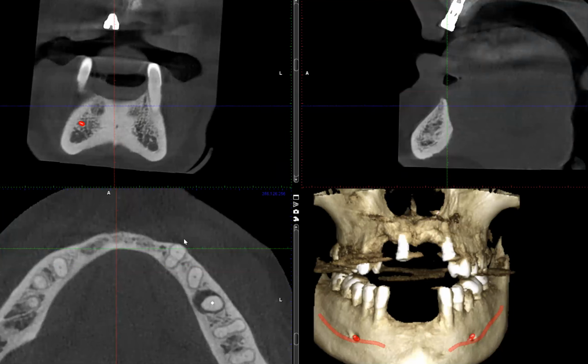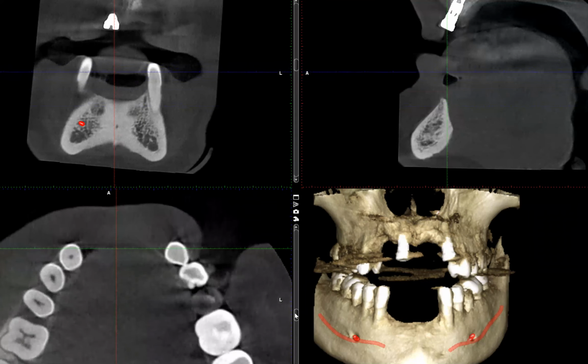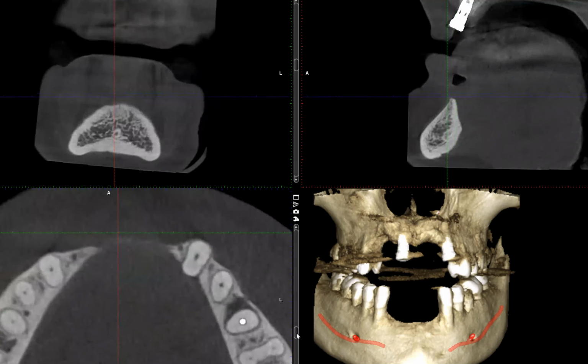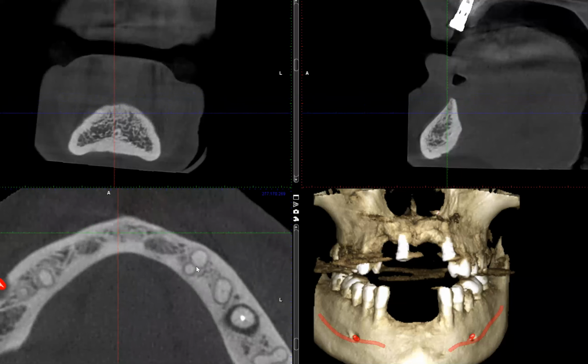At an initial glance, it may not appear like a canine, but I can assure you from this occlusal plane or occlusal level, what you're seeing is molars, two premolars, and canine tooth number 22. And then as we go toward the apex, we can see right here, you see the bifurcation of the canals into a buccal and lingual. And the roots also bifurcate as well.